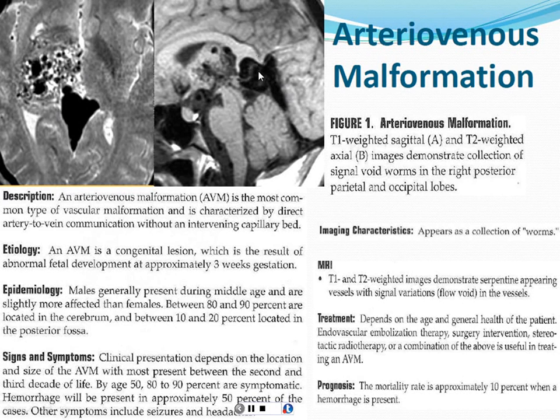And this is another typical appearance. They may not necessarily always be that small. So the way that patients present really depends on where it is. Hemorrhage is often what brings these patients in. Sometimes these lesions will be big and obvious.